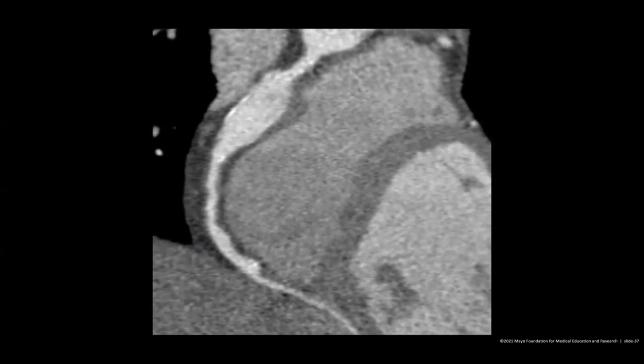Yeah, so this is a 12-year-old patient, and we have a very large aneurysm right here, proximally, some smaller aneurysms distally, and there are stenoses proximally and in the middle portion of the RCA. And so what does this patient have? I'm tempted to say Kawasaki's. Okay, you would be right. So in a 14-year-old, coronary artery aneurysms are going to be Kawasaki's disease, okay?